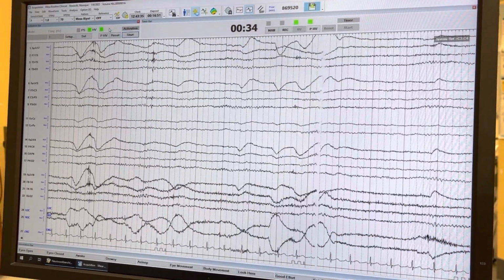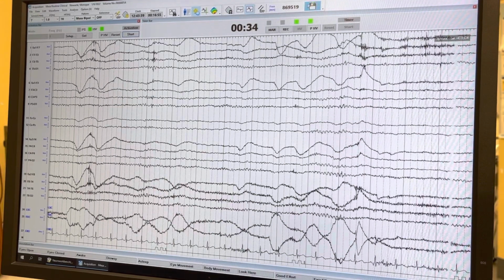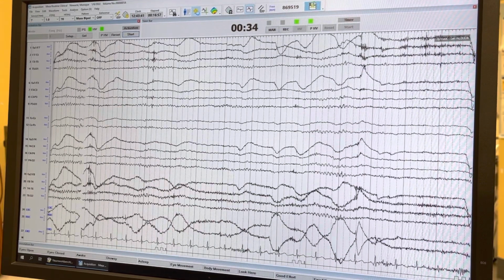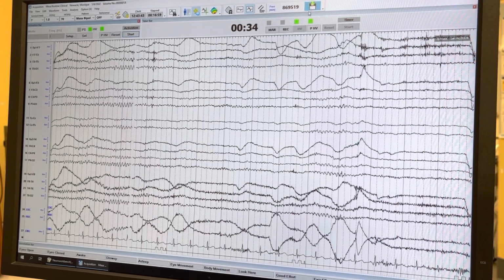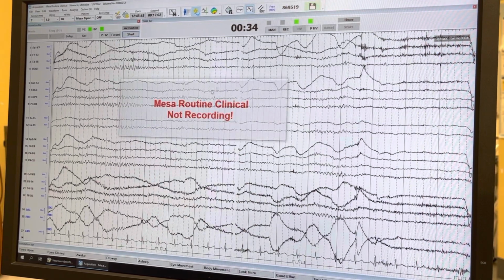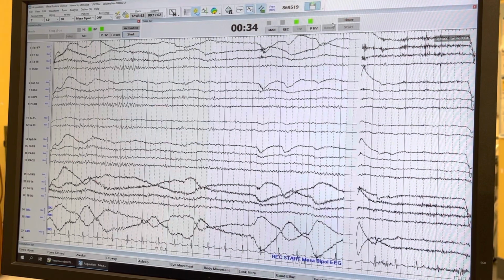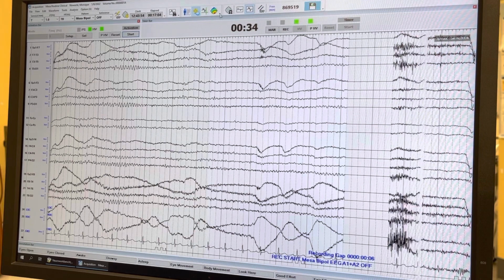Hopefully you guys saw this. Here's where the recording button is. I don't know if you saw that earlier or not, but see how that down arrow's going there. So let's stop the recording. If you click on that, it says not recording. See? Now if you hit it again, it'll start recording. Okay, so where were we?